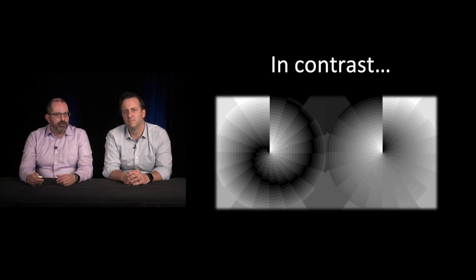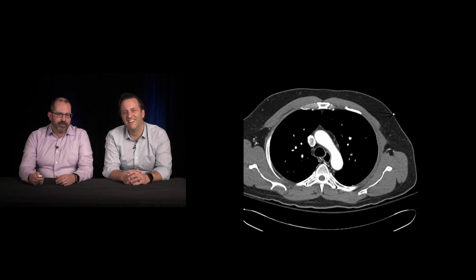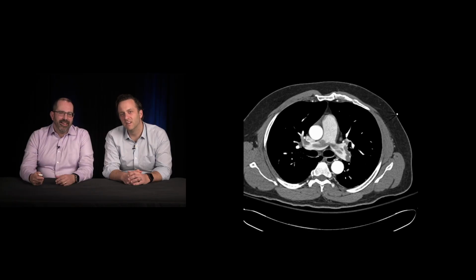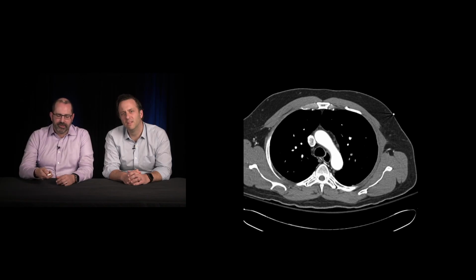In contrast to this one, stop me when you see something. I see a lot of something there. Yeah. So even at the very start, if we come back up and look at this, what the heck is going on? Look at their SVC right there.